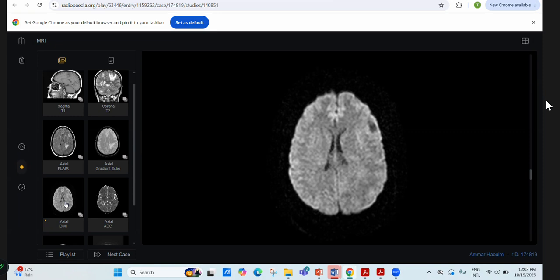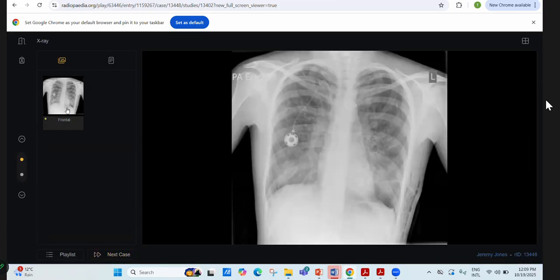What are you going to do next if I say that these are breast metastatic deposits? Now, what is the next line of treatment or suggestion from radiology? If it's a known patient, the patient should have a detailed staging CT, and if there is any other metastatic deposit in the lungs or nodes, that should be biopsied, and the patient should be referred for MDT discussion for further management and planning. Okay. Next case.